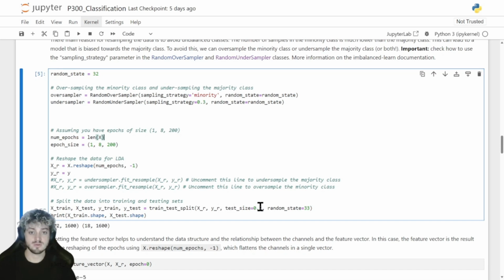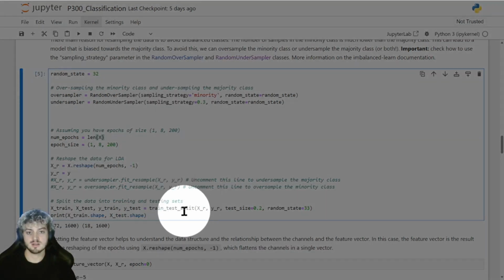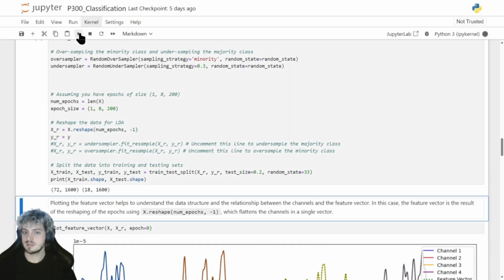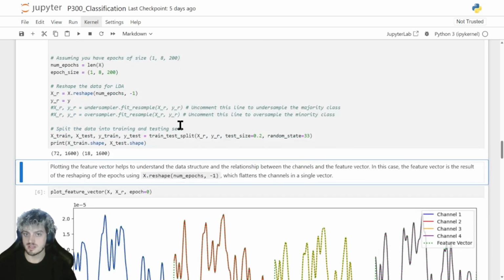For deep learning, if you have a lot of data, you can also pick a smaller amount. The train test split function in the Scikit library is perfect for this simple task. It prepares the dataset for you, giving you X train, X test, Y train, and Y test, so you don't have to worry too much about this step. It's a single function.